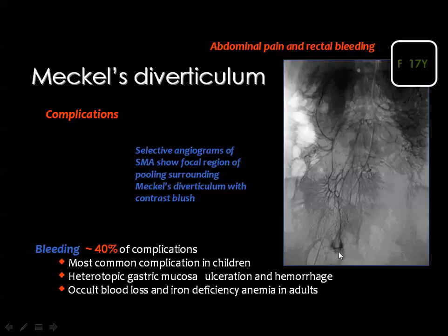Then there will be some blush within the site of the diverticulum because of the vascular ectopic mucosa within the diverticulum itself.